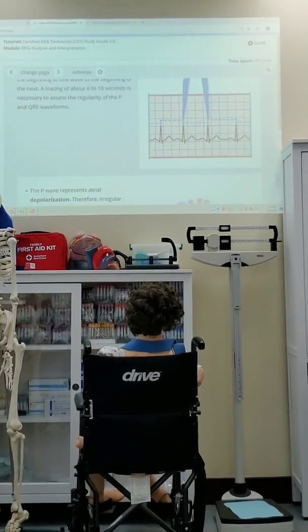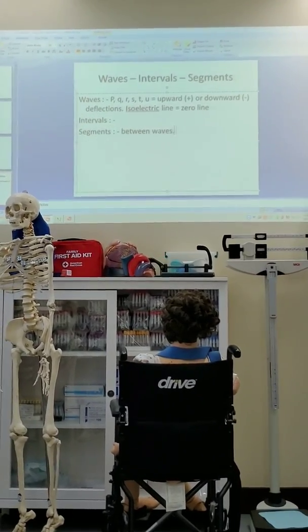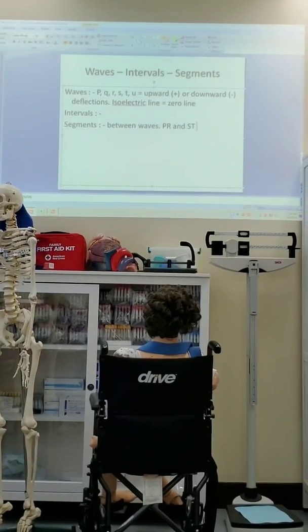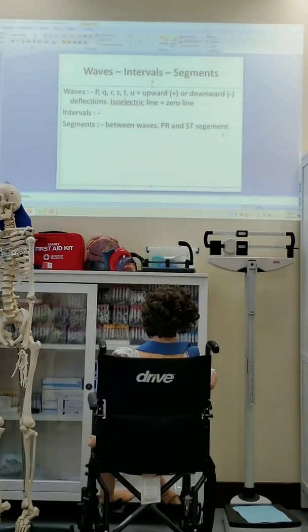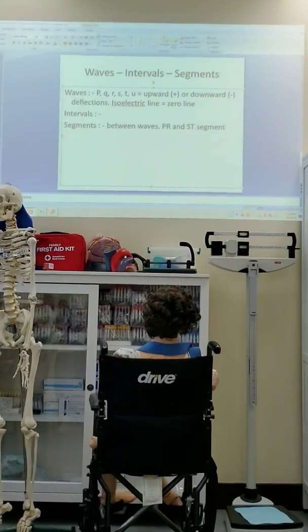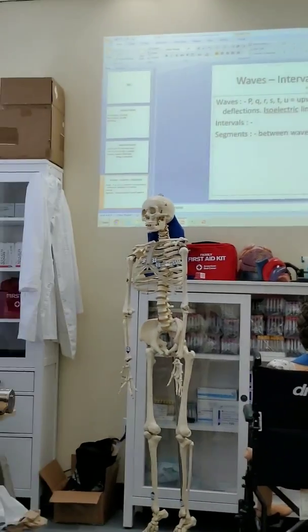So with this we have these different intervals and waves. We have segments between waves, like the PR segment and the ST segment. Why do we learn them here? Because they are very important, especially for the diagnosis of some conditions. A change in these forms shows that there is a change in the heart.